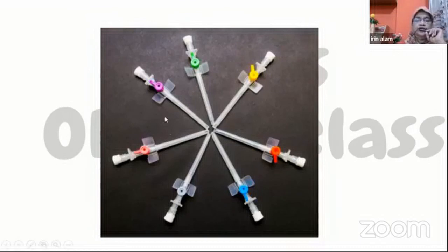These are the cannulas. Cannulas are used to give an IV channel. There are different types of cannula, such as green and pink. This is 18G. This diameter is wider, and blood can be transfused with this. The blue and the yellow are narrow and are used in the pediatrics department.